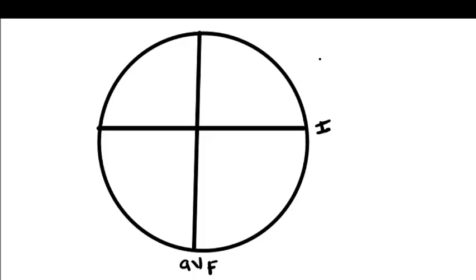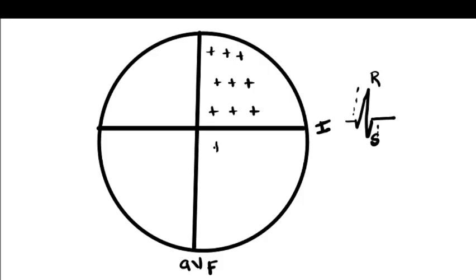The concept here is that if lead 1 QRS is positive, I mean R minus S is positive, here it is R, here it is S. If R minus S is positive, as you can see in the QRS complex I just drew, the S is small compared to R. So if lead 1 R minus S is positive, you need to put positive in this half of the circle that is near to lead 1, not the half that is far from lead 1.